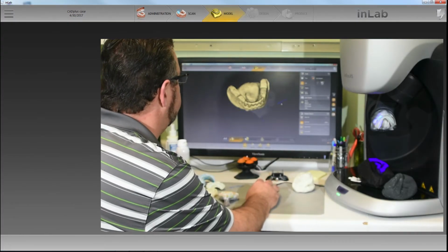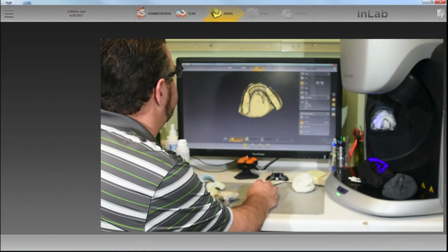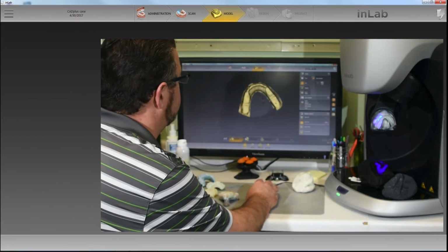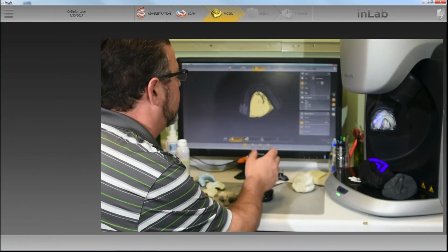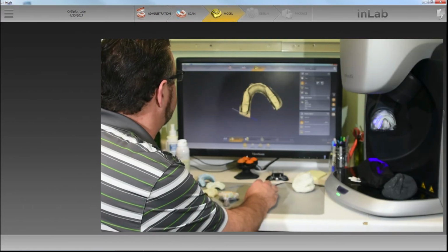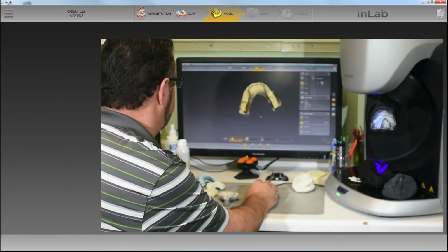Hopefully you're familiar with using the cut tool. If you see after you make a cut, there's a ghost image left behind. That's simply just to make sure it didn't delete the wrong piece. If I click on this piece here, it tells it that that's the piece I want to keep. However, this is the piece that we want, so we'll click there. Once I start another cut, that ghost image will disappear. Then the only way to correct it is to go up to Reset Model and start again. So there's the lower jaw.